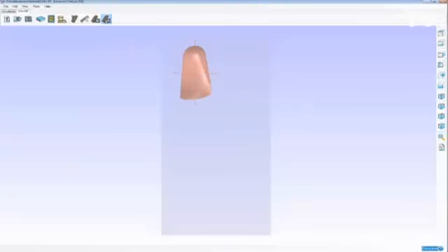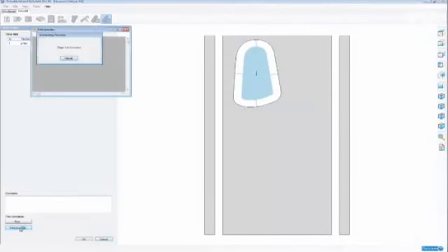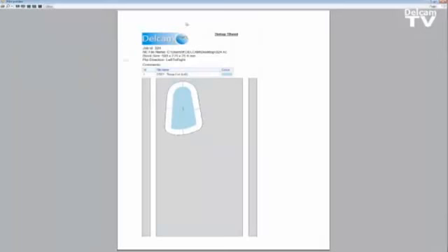So once we are done, OrthoModel also creates a setup sheet that tells us where we have saved the G-code, the sizes of the block, and what patients have been placed on the block, as you can see on the picture below.